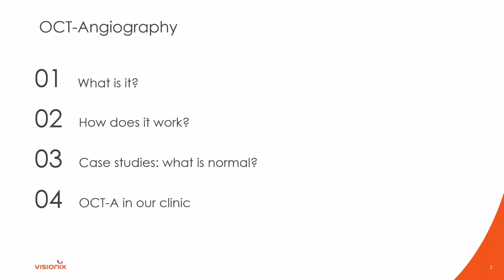So tonight we're going to talk mainly about OCT angiography. We're going to start with OCT and build up, looking at some OCTs, the outer retina, and the main way that OCT angiography is being used, but there's a variety of different things.